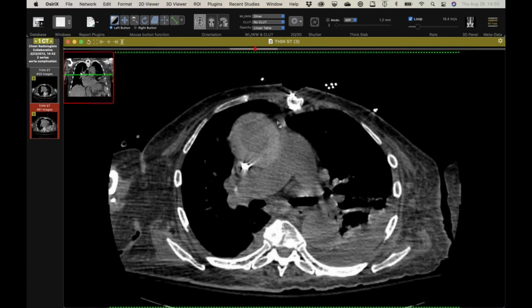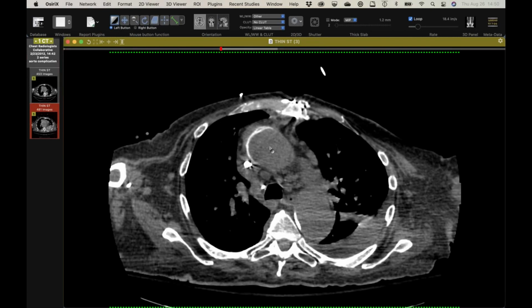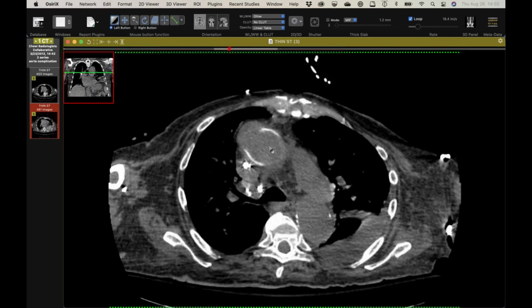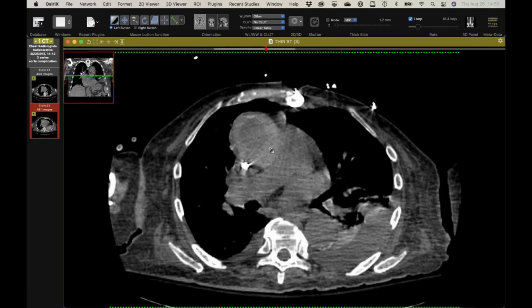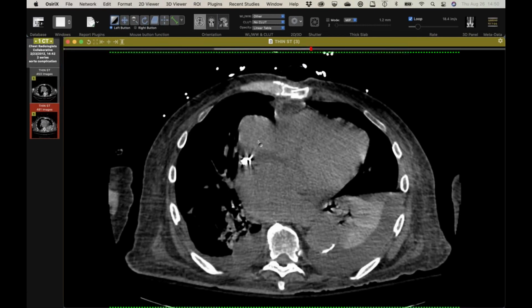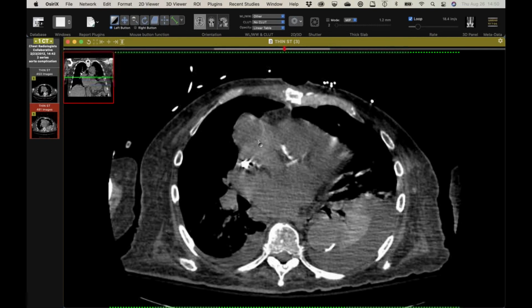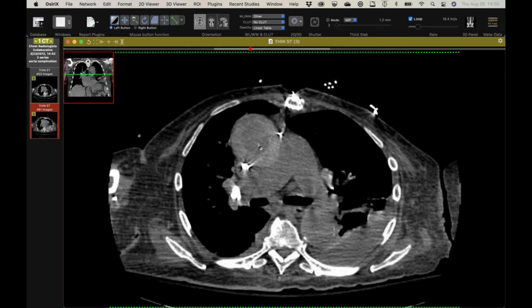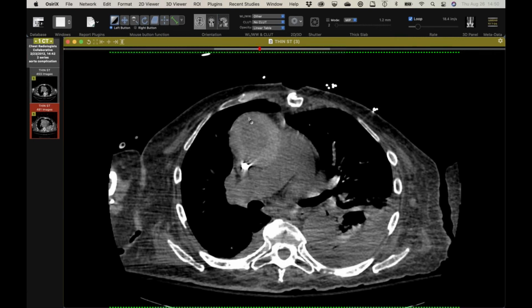And interesting. I had to go dig through the op note because I didn't realize at first he had a graft or where the graft was. I saw this here and I wasn't sure what they grafted, but this is exactly what they did. It's a tubular graft, donor native proximal aorta root. So there's that proximal anastomosis, and then here's the distal. Maybe, yes, so there's not even like a felt pledget or anything in there. So I don't know. Okay.